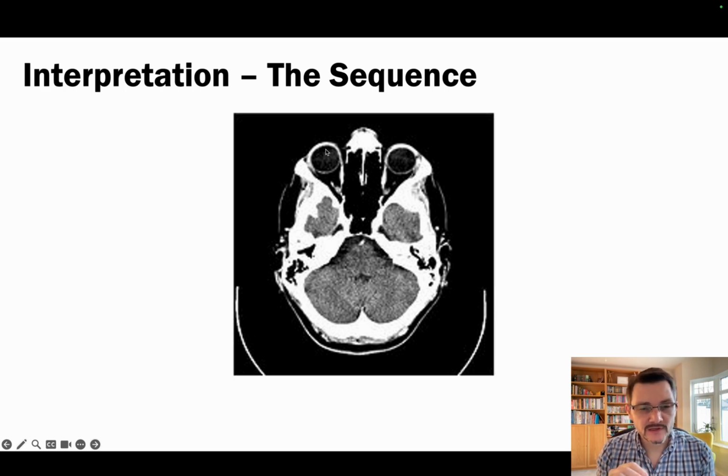We are jumping a little bit. This isn't a full set of CT images. I've taken just about 15 to 20 slices just to give you a flavour of what it's like to interpret a scan. The basilar artery is about to form. It's not quite there yet, but this cerebellum's nice and healthy. The CSF space here is appropriate, and there's the fourth ventricle, and that looks nicely positioned and filled.